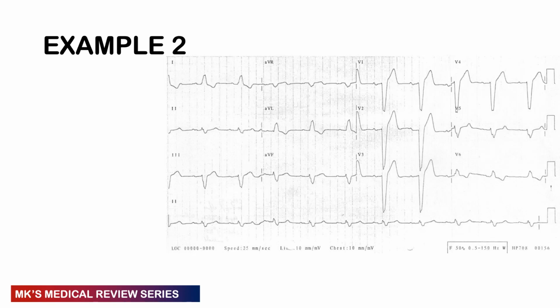Coming now to our second example, you may pause the video right now and work this out. If you don't work this out, you're not going to get the principle. And if you don't get the principle, ECG will continue being hard for you.